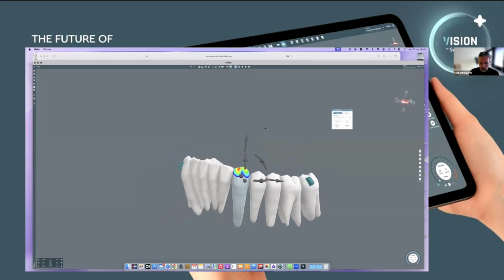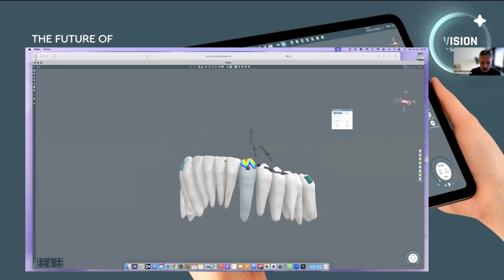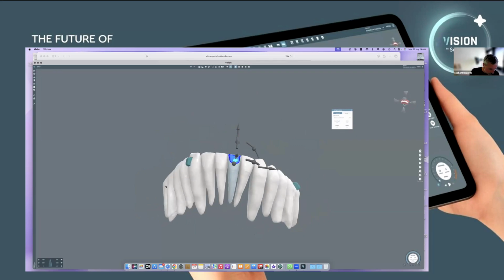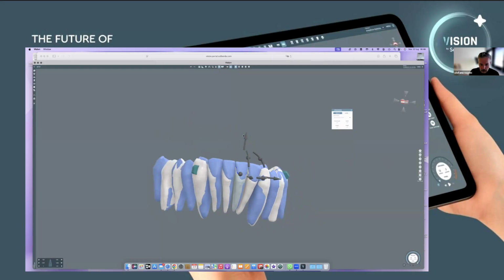Rotation here? No. Okay. And also put here, keeping or not. Let me check the other one. Okay. Yes, this one.